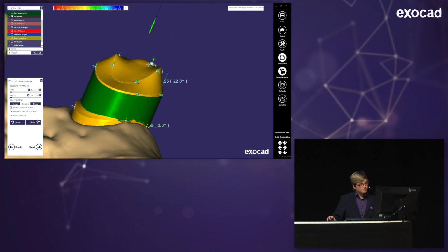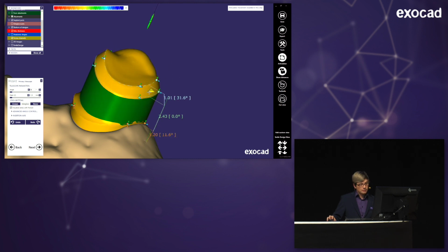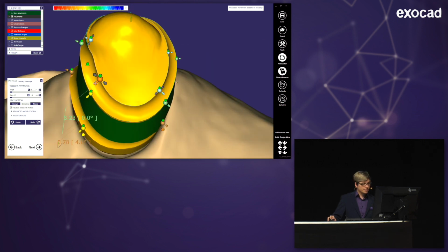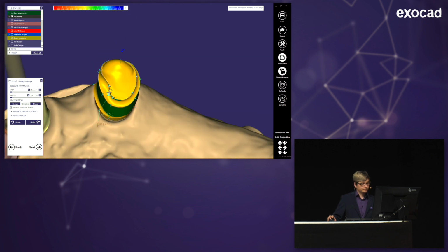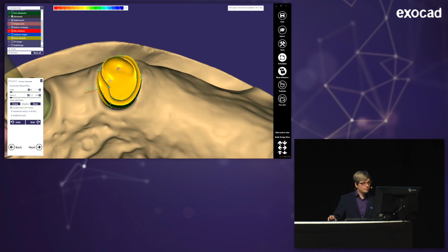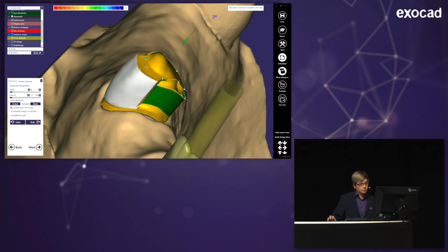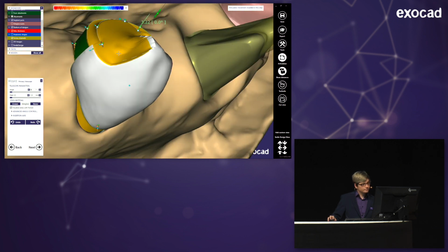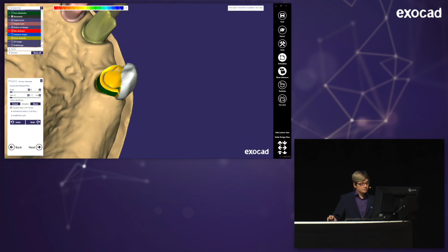And now, again, I pull those points outward, downward, upward, inward, and switch it to parallel, and I have my shoulder. Here a little bit more space. Maybe add another point to correct this. And now again, I'm changing the vestibular part to anatomical shapes. Okay. That's it with that for now.